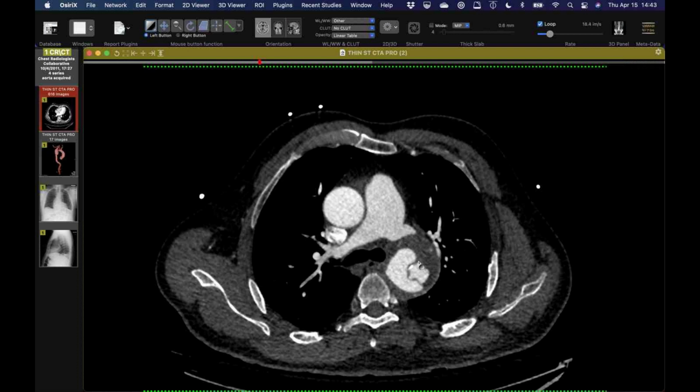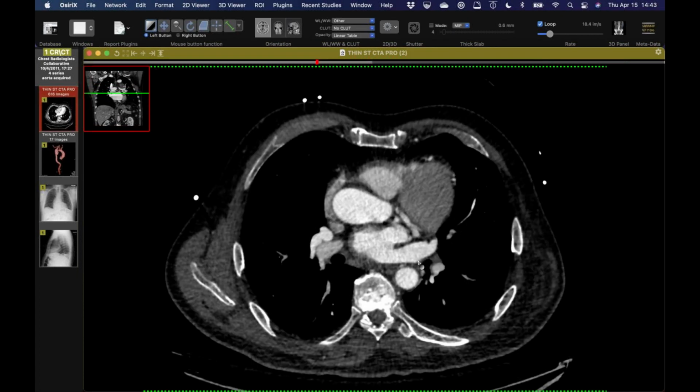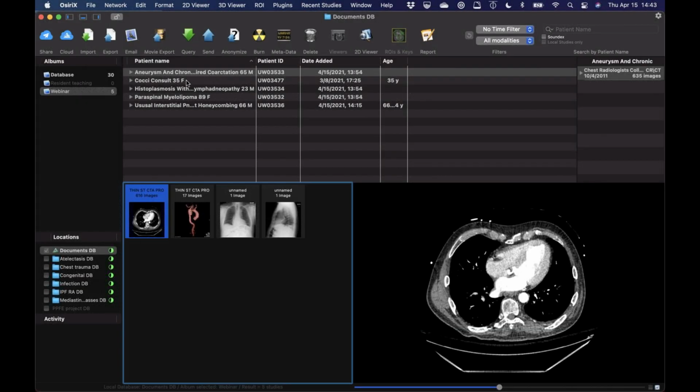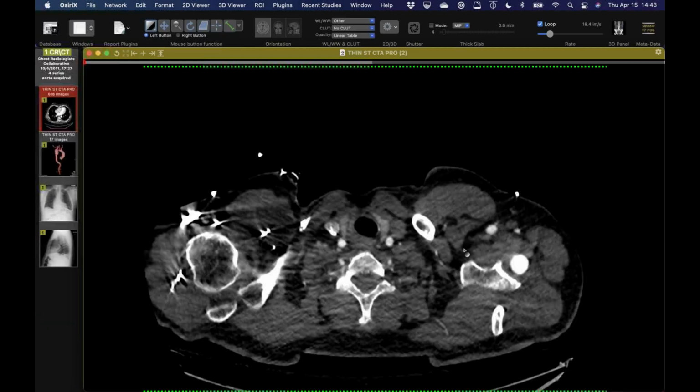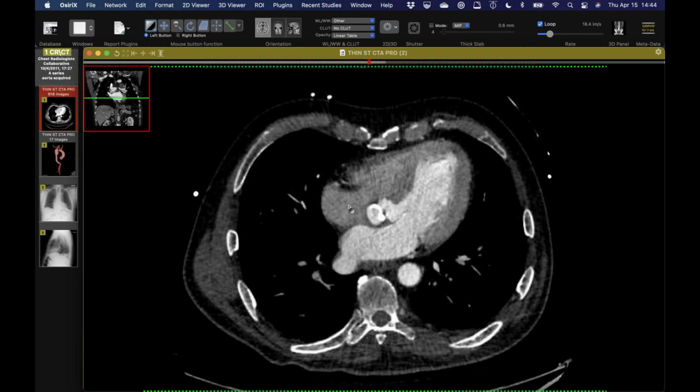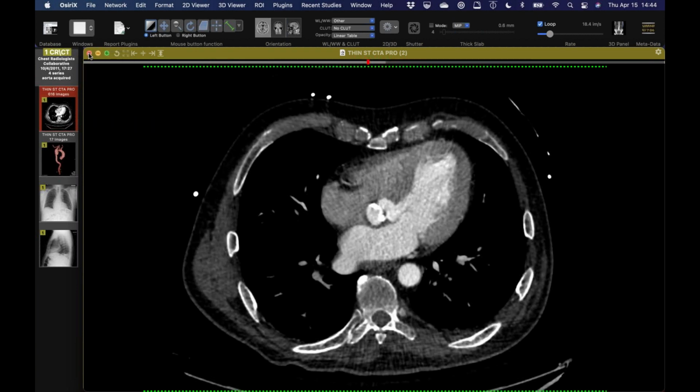So presumably at some point he developed this aneurysm and localized dissection. It's probably been there for a long time. He has no symptoms related to it. So a nice, interesting case; I've not seen anything like this. I can show you the candy cane 3D here, just shows you this sort of saccular aneurysm. You see the little dissection flap in there. Most coarcts that get repaired now get follow-up in some sort, but this gentleman did not. So I don't know if anyone else has ever seen anything like this.